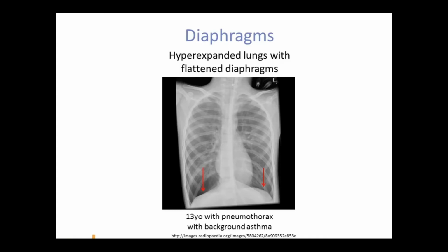The diaphragm is usually visible at the level of the 9th or 10th rib. Curving of the diaphragm may result from phrenic nerve paralysis, liver enlargement, or an abdominal tumor. Loss of clarity in the area of the diaphragm is most likely due to pulmonary collapse or a consolidation obscuring the diaphragm. Also examine for the presence of free air underneath the diaphragm. A marked elevation of the diaphragm may be due to a loss of lung volume, paralysis of the phrenic nerve, replacement of diaphragmatic muscles with fibroelastic tissues, a congenital diaphragmatic hernia, or subpulmonary effusion.